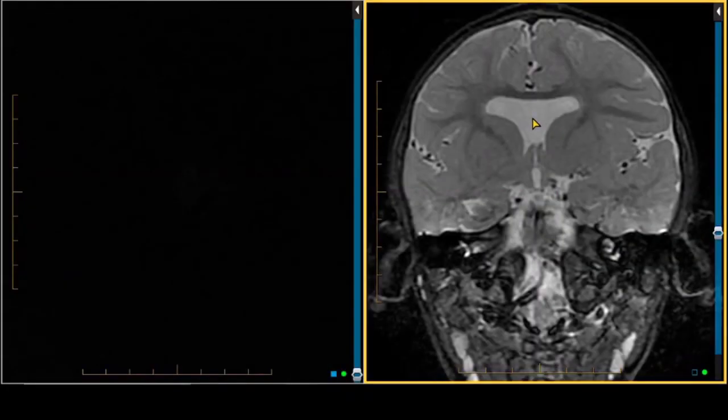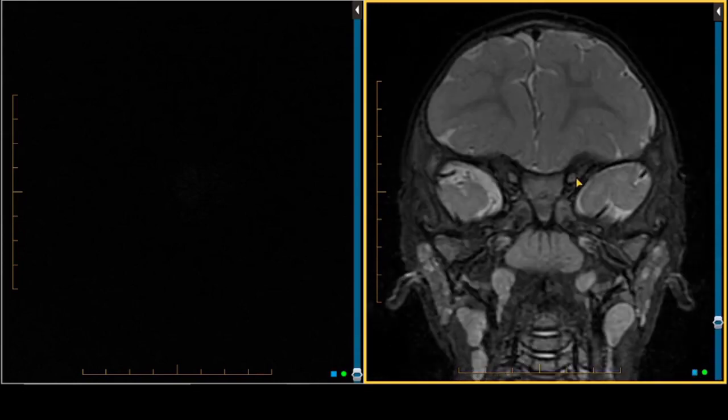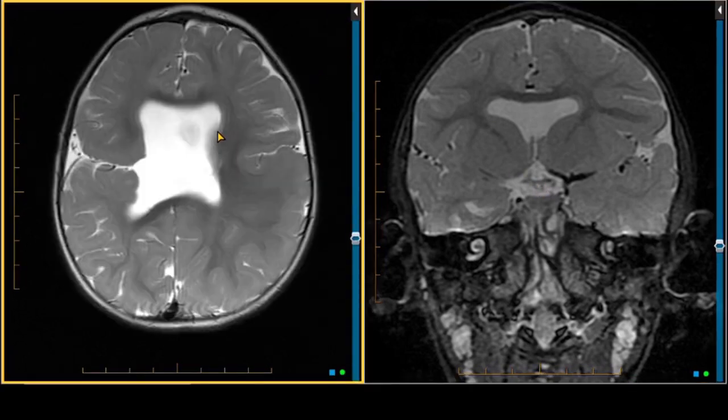This is an MRI of the brain in an 11-month-old child with small optic nerves that were identified on ophthalmologic examination. On this coronal image, we see absence of the septum pellucidum and otherwise relatively normal appearing lateral ventricles. If we go forward, we see a smaller than expected optic chiasm and smaller than expected optic nerves. So those are the features that we've described with septo-optic dysplasia: absence of the septum pellucidum and hypoplasia of the optic pathway. Now, there's additional features that you can sometimes see.